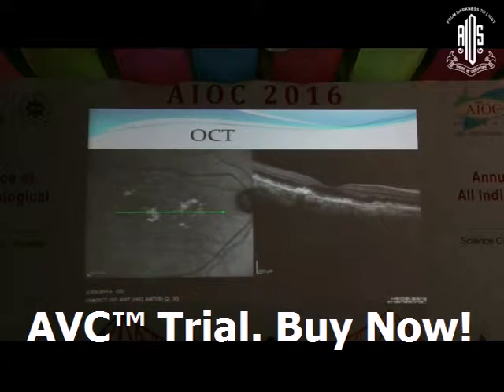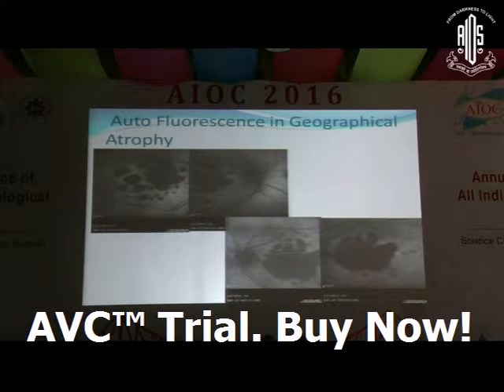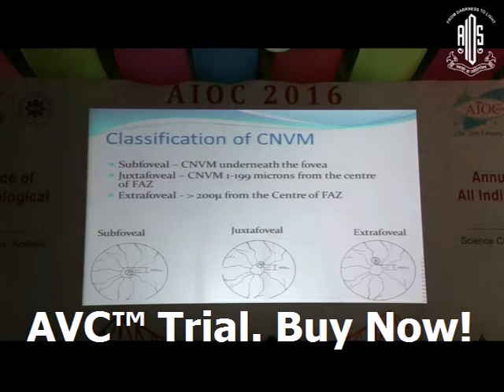On OCT, drusen will mimic RPE undulations, and these are autofluorescence pictures of geographic atrophy, which is best diagnosed on autofluorescence. If you do fluorescein angiography, this will appear as white, hyperfluorescent lesions with well-defined margins till the late phase. But the progression of this disease is best followed by autofluorescence, and you can see this hypofluorescent area. These are areas of geographic atrophy.